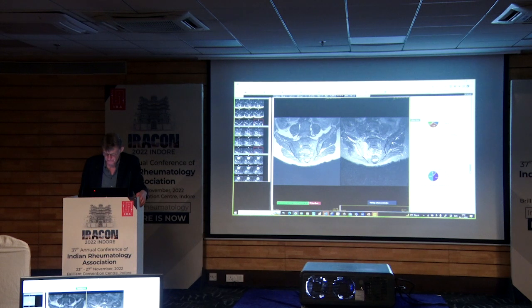And then what other features are present? And you can say the top runners here are soft tissue inflammation and unilateral inflammation, which I totally agree with. And then the majority of you says that it's probably not axial SpA, which I also agree with. And then the majority says that it's septic sacroiliitis, and a minority says that it's actual spondyloarthritis. Great, I think that's a good thing.